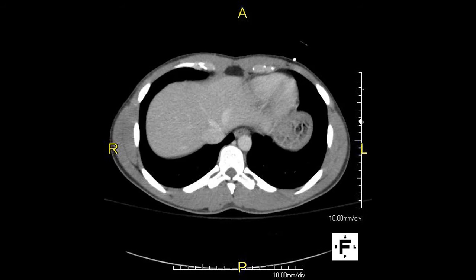Another new structure has appeared, and I'll circle that in green right now. So we have two structures we have to identify, that new one in green and the one from a couple slides ago in yellow. So let's go ahead and move on to a cartoon image and orient ourselves.